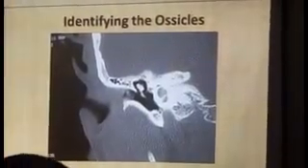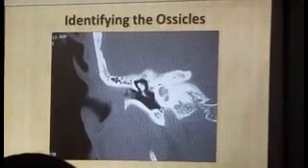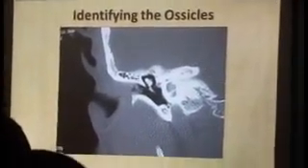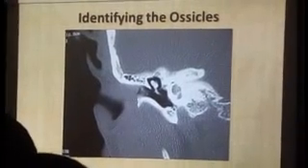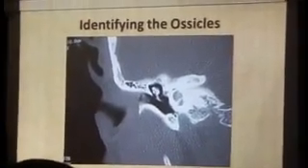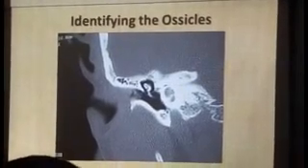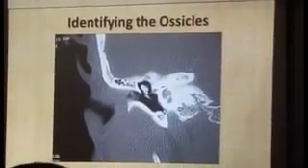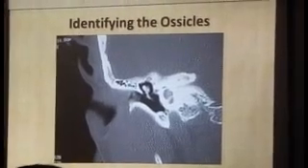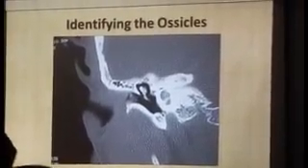The other part is this bilobed structure. Never make the mistake of considering this either as the body of the incus or solely as the head of the malleus. This is the incudomalleolar joint, with the posterior part being the body of the incus and the anterior part being the head of the malleus, and the dimple indicating the junction of the interface.